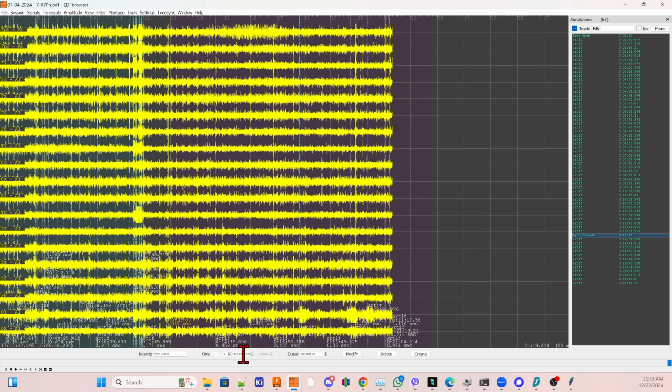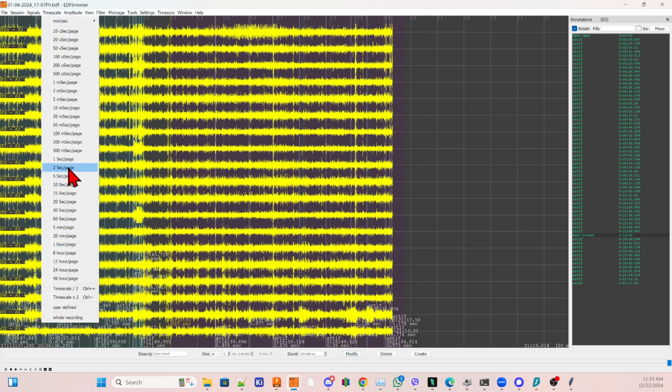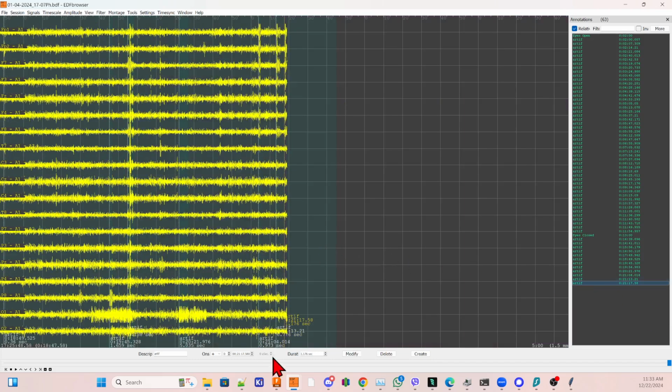So I'm going to change this here. Instead of the duration, I'm going to reduce it by 60 seconds, modify. Okay, so we're still sticking out. Let me go towards the end here.